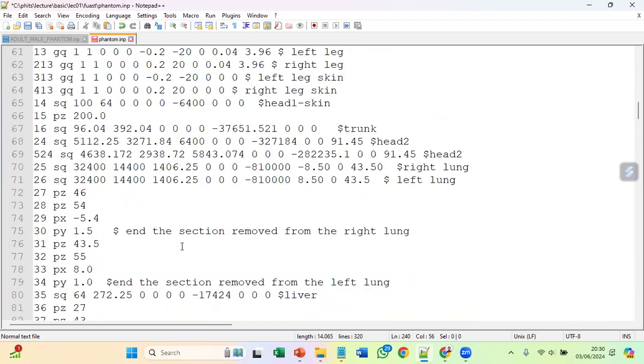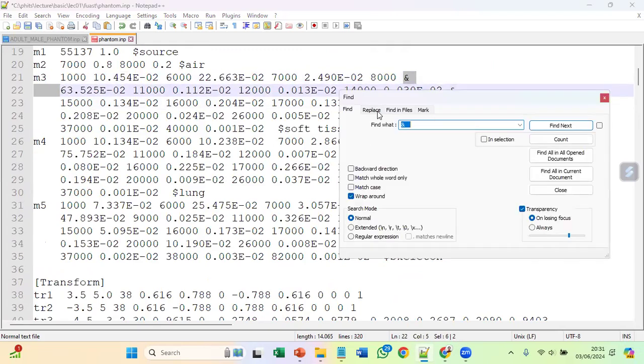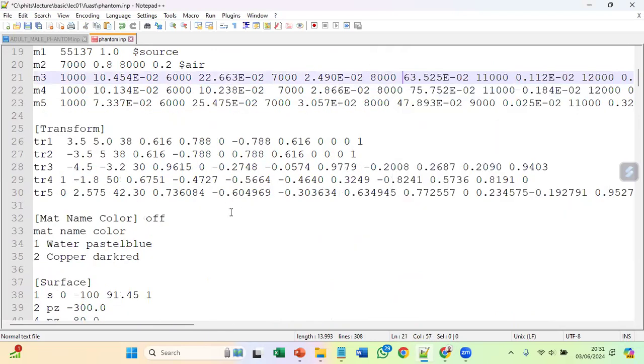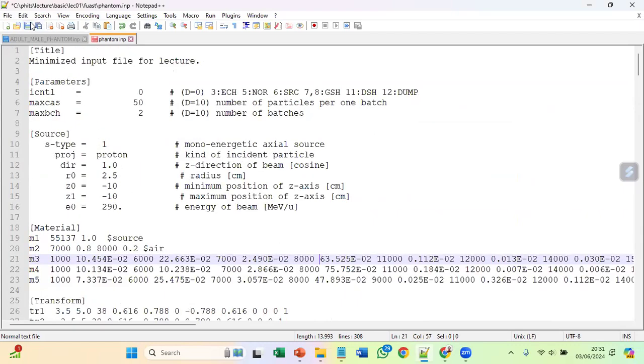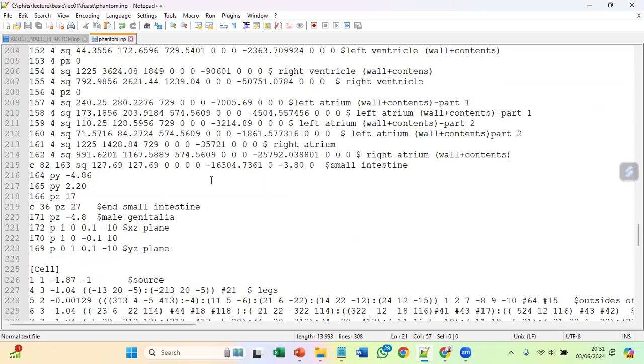Let's see. And we have a few more. We do the same thing. Yeah, I think that's all.